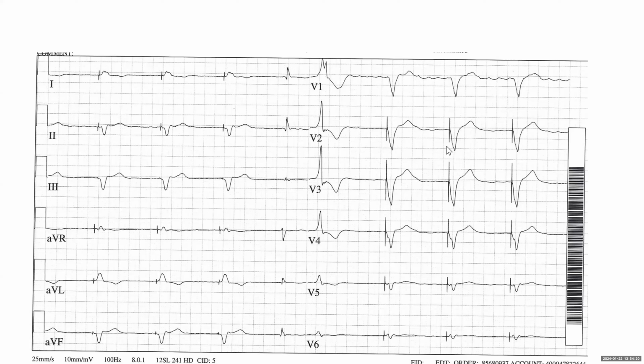Okay, any other comments? Is the baseline AFib? Yeah, baseline is AFib. Okay. Any questions about this ECG?